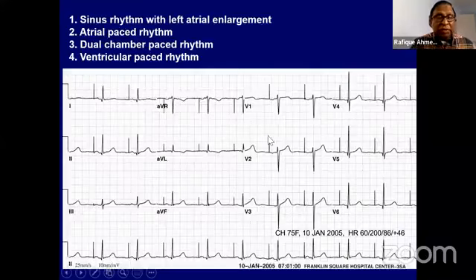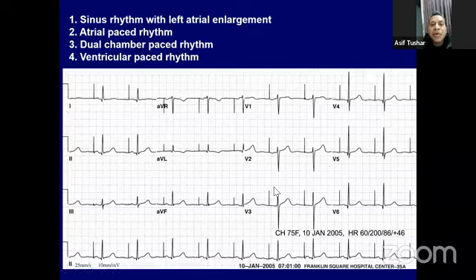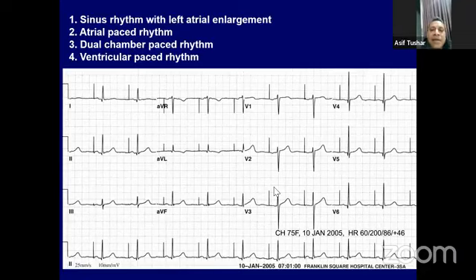So I'll show some ECGs and we'll have a question. Do we have the poll? There are 62 participants, except for the faculty. I would like everybody to answer. Mr. Kamrul, please arrange the poll. Yes. Keep the ECG for 20 seconds, sir.